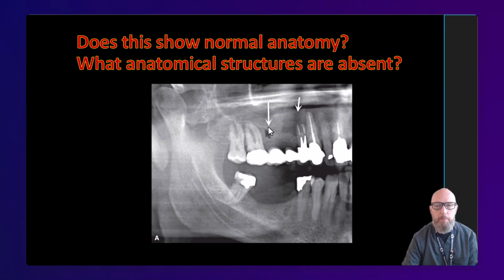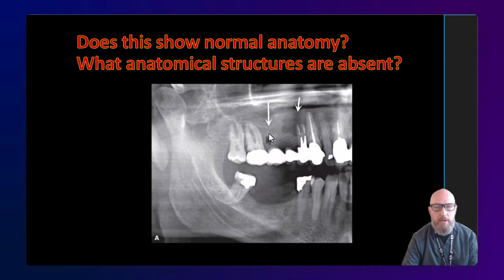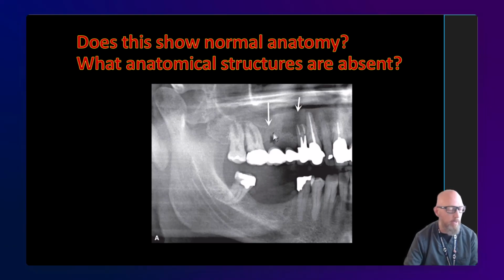What happens to the border of the maxillary sinus? Again, this is an ill-defined, destructive lesion with irregular borders. It loses that smooth curvature, and right here we see part of the border, but it extends outside of there. And so this is what I would define as ill-defined. The zygomatic process is still intact, so it's not quite as destructive as the last one, but you can see the focal area of bone loss has these ragged borders and it extends in an ill-defined manner. This one turned out to be lymphoma.